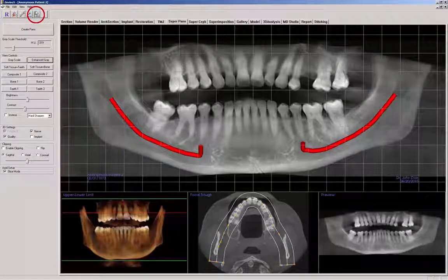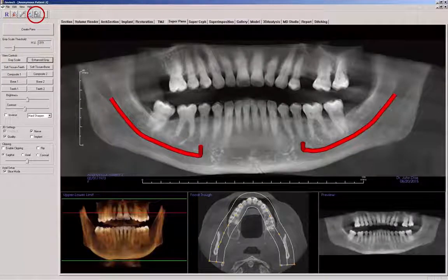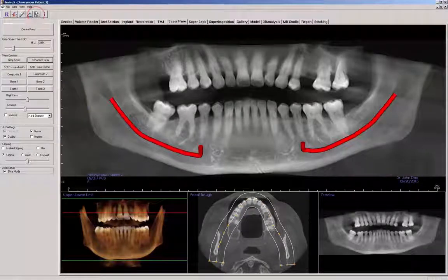A click of the grid icon will overlay a grid with cells 10 mm squared. Click again, and rulers appear again with 5 mm between the tick marks. The rulers will now be shorter than the default ones to accommodate printing.